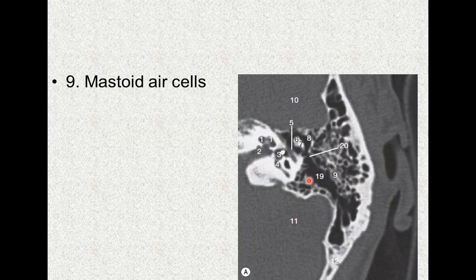Mastoid air cells, and this is a high resolution view of the petrous bone. This is the mastoid air cells.